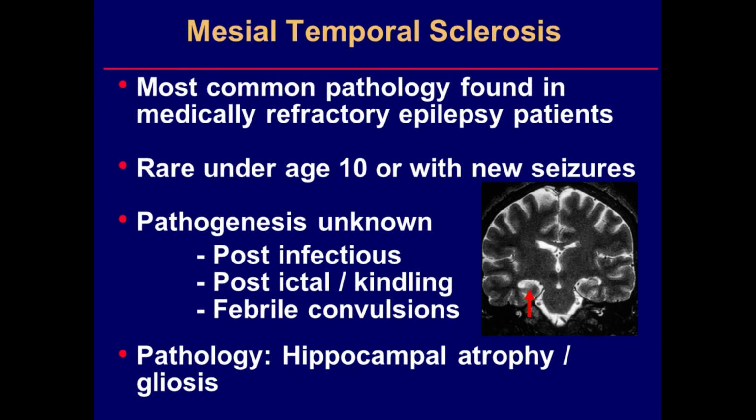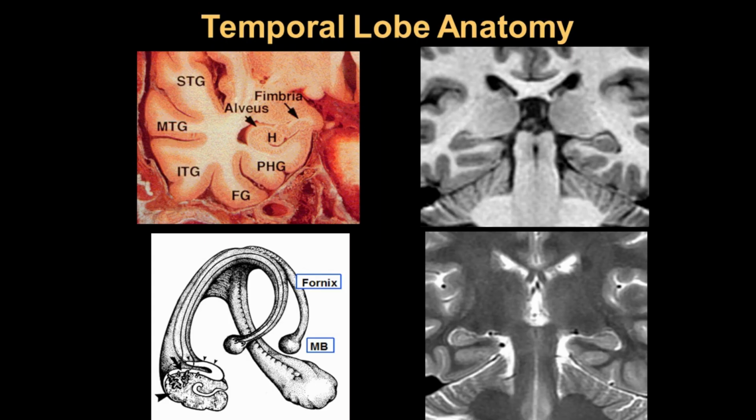This is a finding you won't see incidentally on imaging for any reason, and so this is an important finding, and as you'll see, could be the key to cure of this patient's epilepsy, since if it corresponds to the appropriate clinical setting and EEG findings, this imaging finding means that temporal lobe should come out, and it's likely to cure the patient.